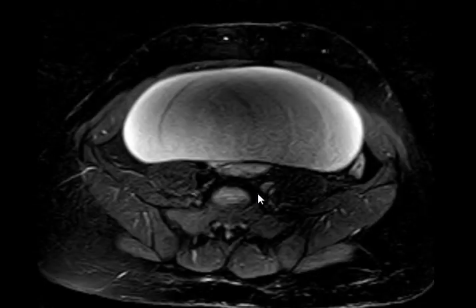Could it be a mesenteric cyst? Why not? I totally agree, it could be a mesenteric cyst coming down. So the question is, from where is it arising? If it's arising from the abdomen going to the pelvis, it could be a mesenteric cyst, could be what else? From abdomen down.